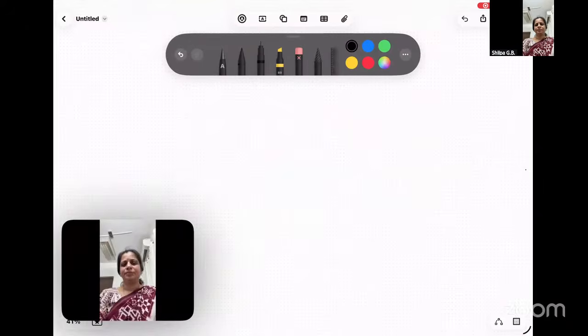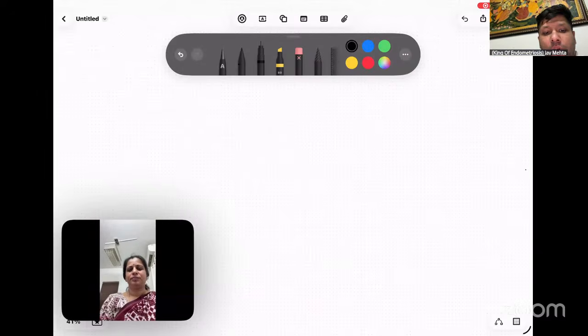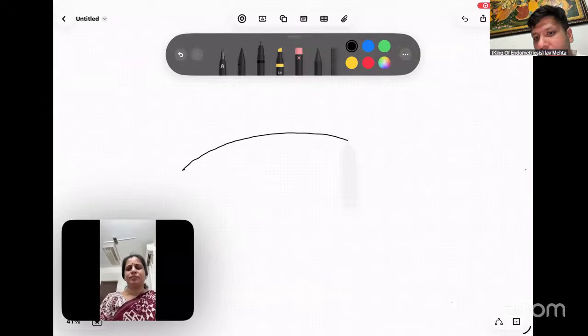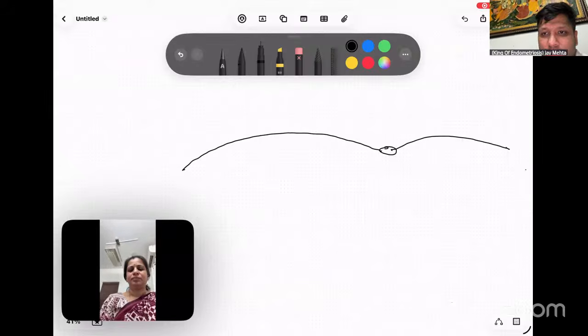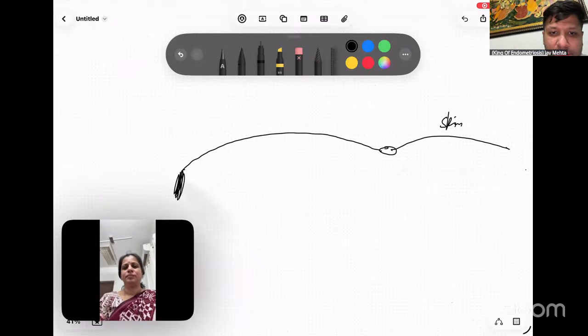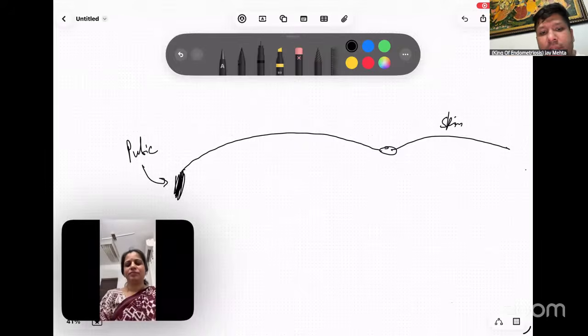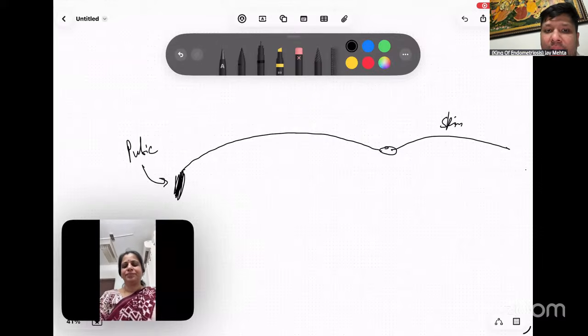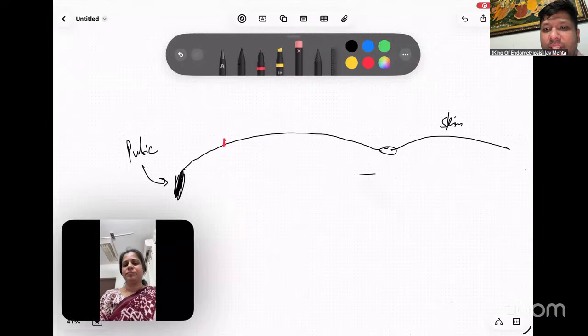Yeah. So when you see my screen, the most important thing, today's topic is abdominal wall endometriosis, right? So what is the abdominal wall that we are trying to look at? So this is the umbilicus, okay? This is the layer of the skin, all right? And this is the pubic symphysis here. So basically, when we are trying to talk of this particular disease, we are trying to talk of endometriosis, which is present in the abdominal wall, typically at a scar site. So this scar site is going to be, of course, the lower segment caesarean scar or in and around it.